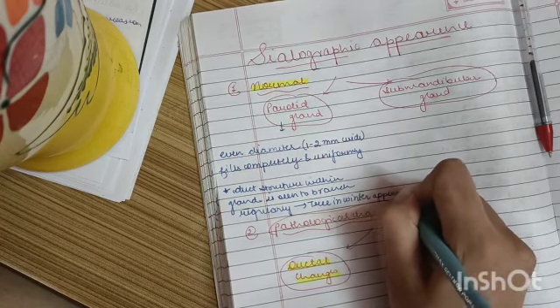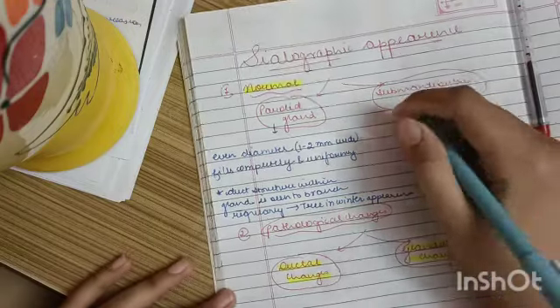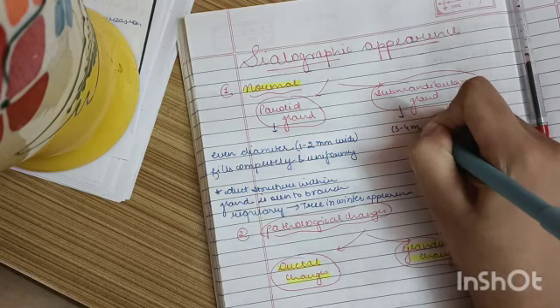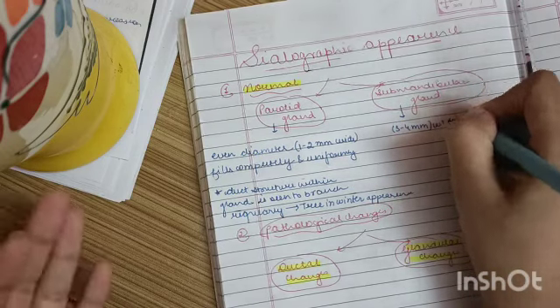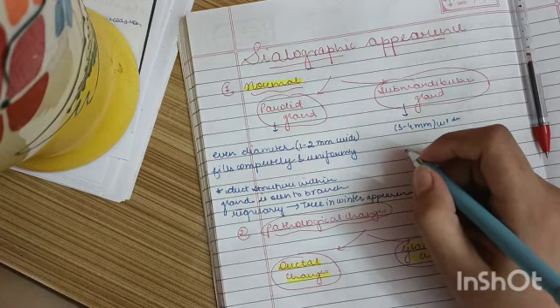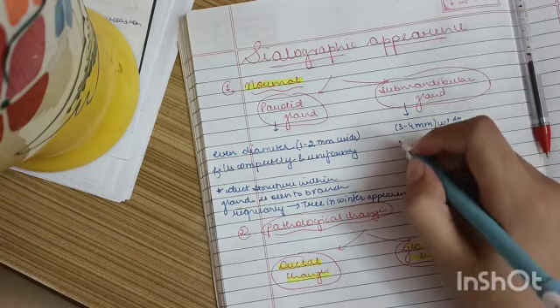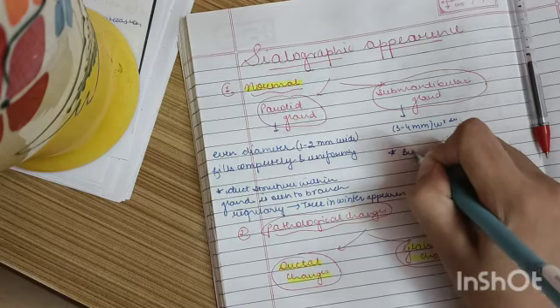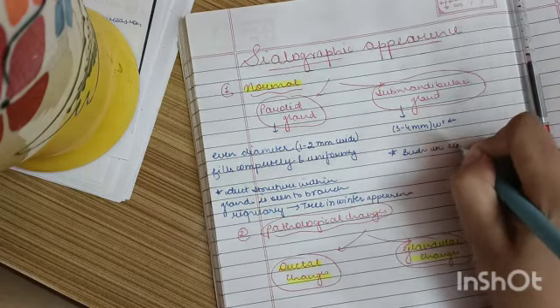winter appearance. Now, the submandibular gland also has an even diameter, around 3 to 4 mm wide. Same point, you have to mention that it fills completely and uniformly. Similarly, the duct structure shows branching with gradual tapering towards the periphery, and it shows a bush in winter appearance.